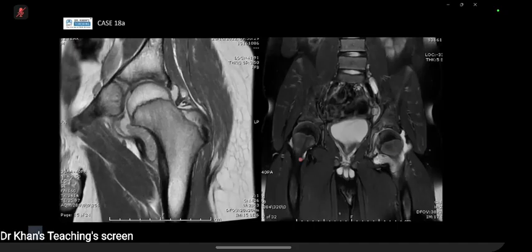There's a large joint effusion on the left, not on the right, as there's always going to be a little bit of joint fluid that's within normal limits. What's interesting is the presence of this synovial proliferation, almost looking like rice bodies. It's just the appearance of it. Of course, we often think of it in something chronic, like chronic TB, RA. The interesting thing here is there's not much in the way of marrow edema.